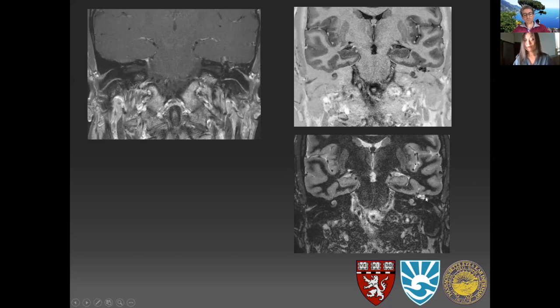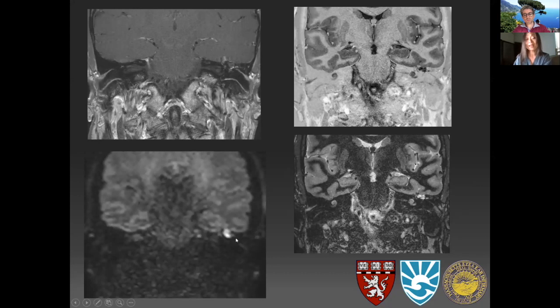And just to confirm, we get it a different way. So the fluid is bright, and we can see there's no gray matter in that area. But instead, it's right on the coronal DWI. I think recently this was just being tweeted around. Dr. Dufour had articles published indicating that the echoplanar imaging technique is not always optimal. So when we choose a non-echoplanar imaging, and especially the coronal plane, that really helps us in not getting fooled into false positives or false negatives.